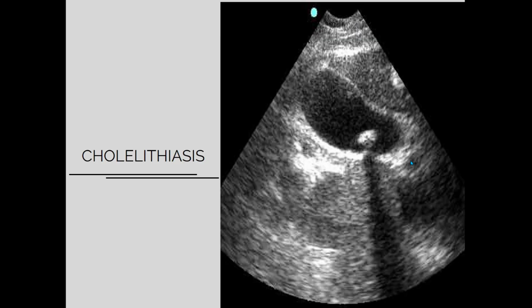so this is ultrasound, and here you can see this is hyperechoic. Why hyperechoic? Because this is bright, this is much more white. Okay, and along with this you can see this is posterior acoustic shadowing. Okay, since the shape is that of the gallbladder, and here you can see some hyperechoic lesion with posterior acoustic shadowing, so your diagnosis is cholelithiasis.